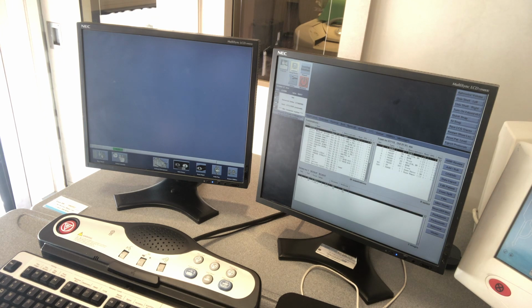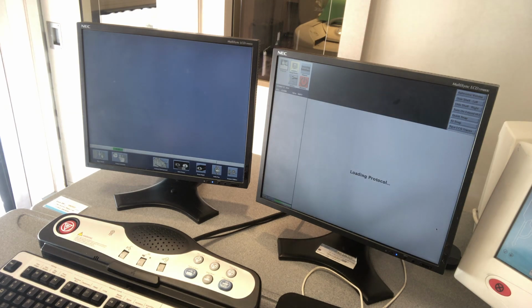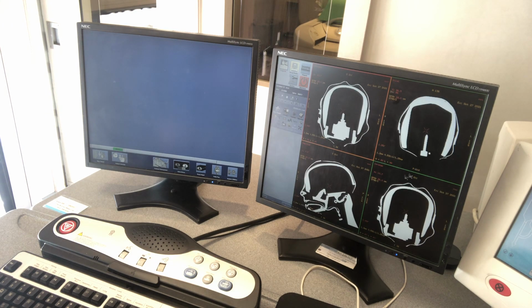You've got to click your patient. Now we work off of the thins when you do your reformats. So you highlight the thins, come down here and hit reformat. Now it's going to load up these images, but we're going to work off of the right top box here, and you'll see this little blue around it.